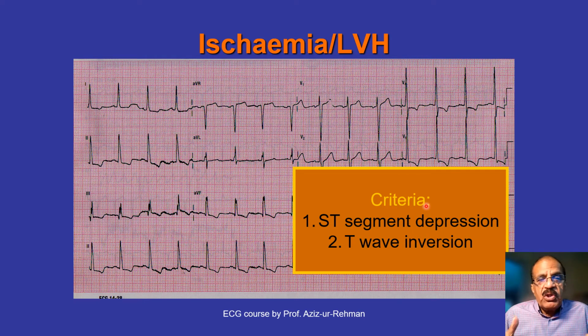So if the exertional chest pain is typical of ischemia, like the pain is central, constricting in nature, or compression, or burning, and it is not easily localized. It spreads across the chest, it radiates to the jaw, the shoulder, the arms or the back. There is diaphoresis, and the moment the patient stops exertion, the pain goes within minutes. So that is very typical of angina. I think in this patient, this ECG should be interpreted as coronary artery disease.